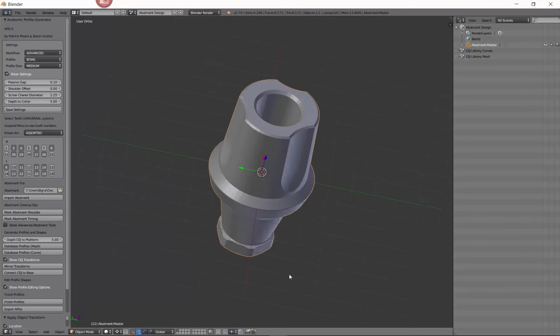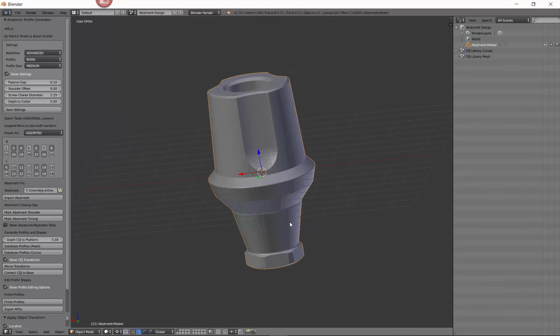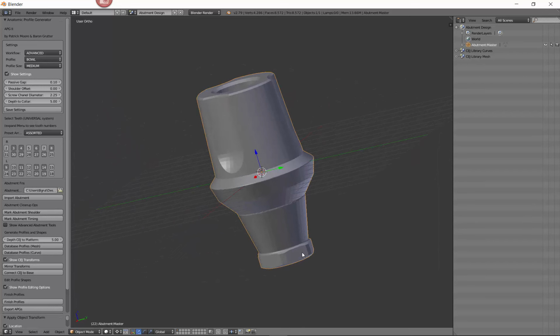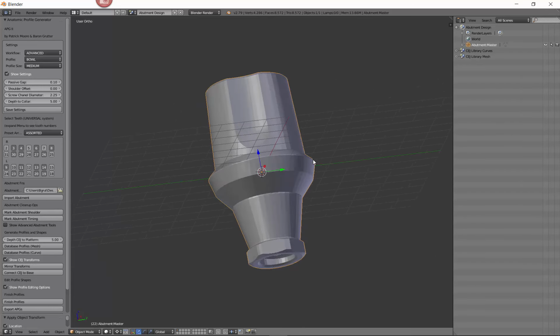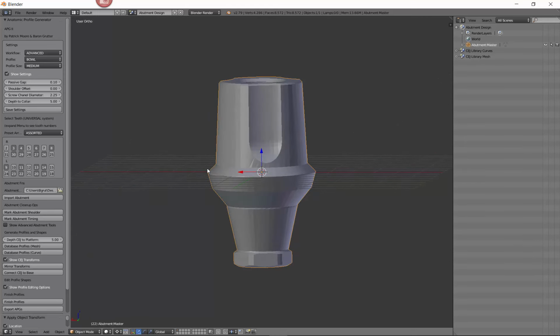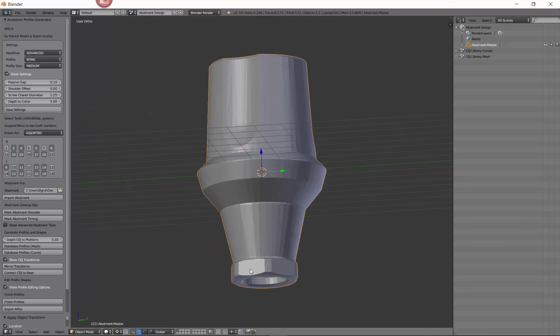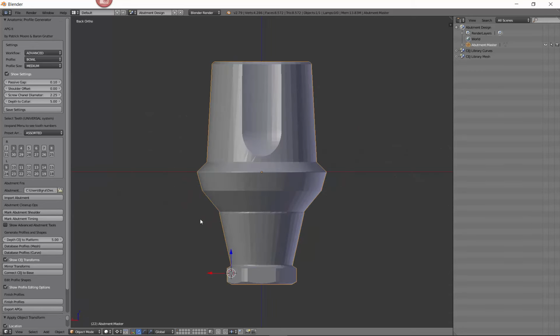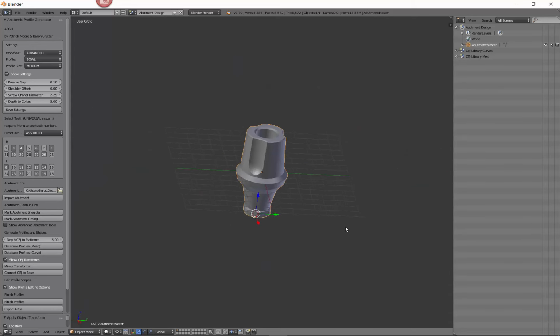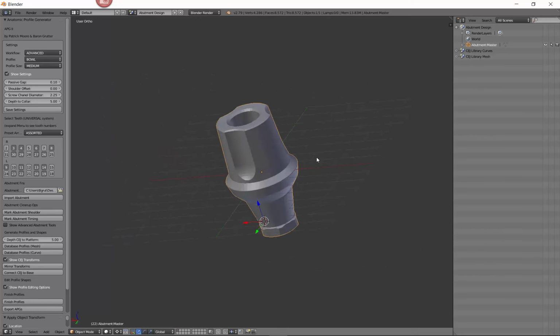If you want to mark the timing, because we want to have flat to the outside or whatever, well, then in that case, I'm going to come down here. I'm going to find something that's flat. Unfortunately, nothing up here is flat. It needs to be vertically flat. Let me clarify. But down here, these sides of the hex are flat. I'm going to click right here, and I'm going to say Mark Abutment Timing. And there we go. So now it is rotated. It's got the flat of the abutment oriented properly, and we're good to go.